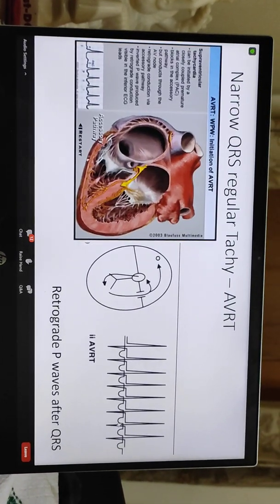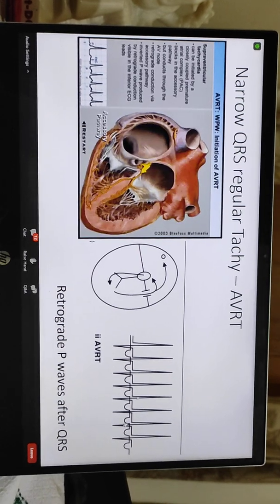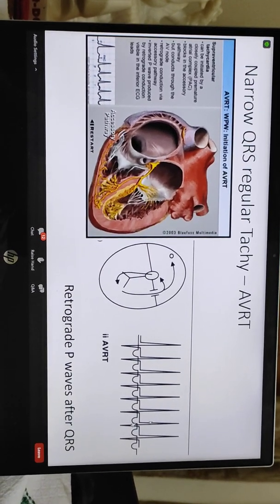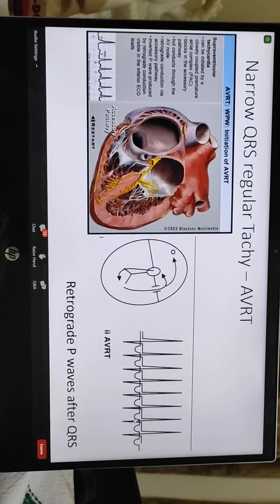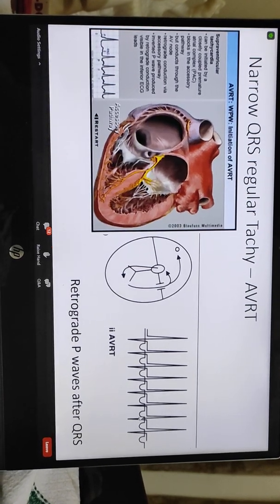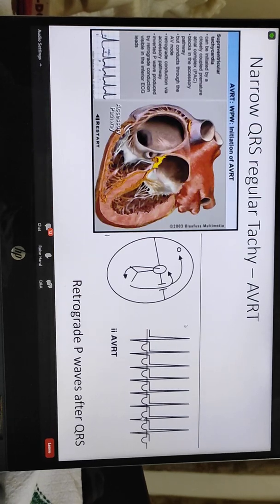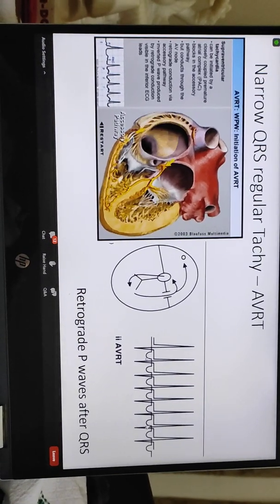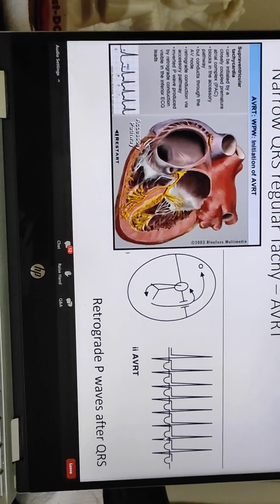So the important thing to understand is how to recognize, during the tachycardia itself, that this tachycardia is due to orthodromic tachycardia of the WPW syndrome. When you have a previous ECG, or after converting the rhythm, if you are diagnosing the WPW syndrome, many people will diagnose it. But if you don't have any ECG from before, how do you know, during the tachycardia itself, that this tachycardia has underlying Kent bundle pre-excitation?